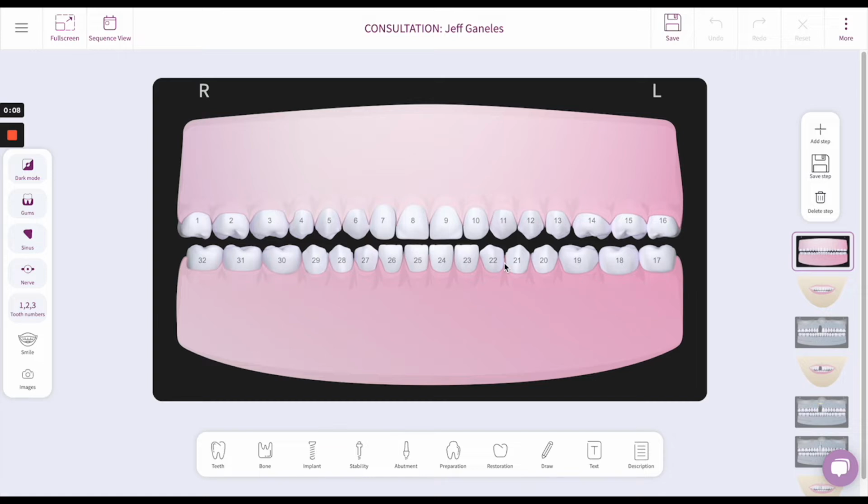I'm very pleased to be presenting this new tool from Ostel for patient education. It's similar to a product I've used for years and has sold millions of dollars of dentistry and educated patients about what their problems are, how we can fix it, and what the sequence of treatment is going to be. After all, if we can't educate our patients about what their problems really are, then we can't really present valid treatment options and also build value for the procedures that we're going to do.